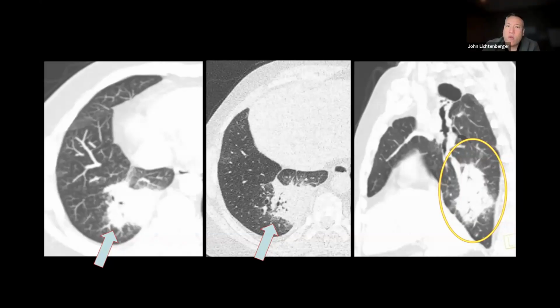This kind of airway dilation can happen in the acute lung injury phase associated with the clinical manifestation of ARDS. However, in this case where we see these airways dilated over multiple scans, we really should be thinking about a chronic process here. So, chronic intermittent obstruction. Here on the sagittal CT, we see the same consolidative opacity in the right lower lobe.